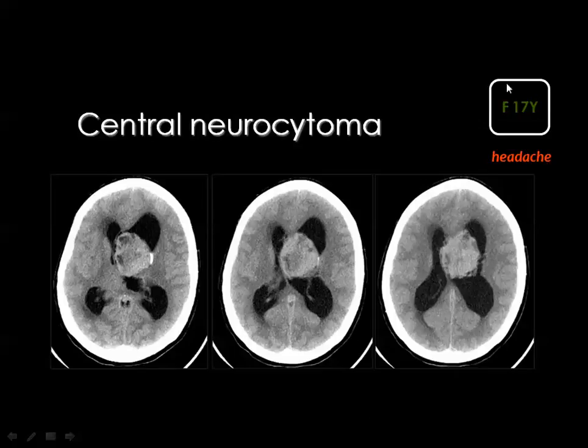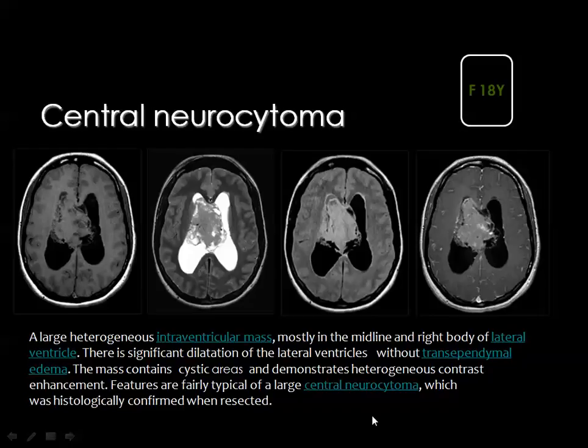This is a female 17 years old presenting with headache, and this is the tumor in the left lateral ventricle showing some foci of calcification and also minute cystic changes, and it is a good example for central neurocytoma. And this is also a good example for central neurocytoma in a female 18 years old.